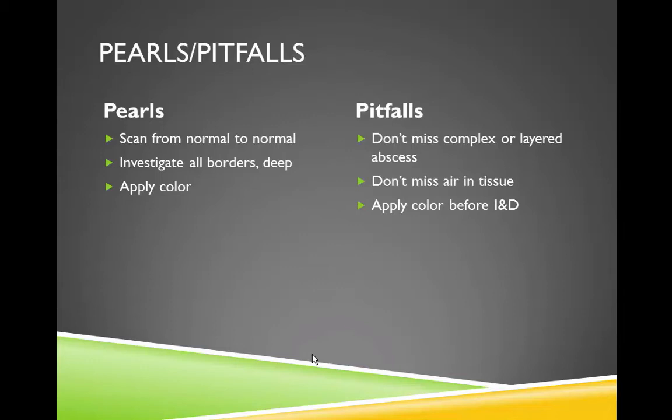And things to look out for, pitfalls: don't miss a complex or a layered abscess just because it's not a perfect, simple fluid collection. I've done it in the past and learned from my mistakes, so hopefully you can see these examples and not make the same mistakes I've made. Don't miss air inside the tissue, which might signal a more serious infection that needs operative treatment in the OR. And then again, I said it before, I'll say it again, apply color before you stick a knife in anything.